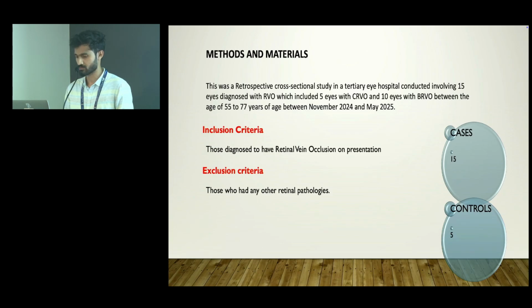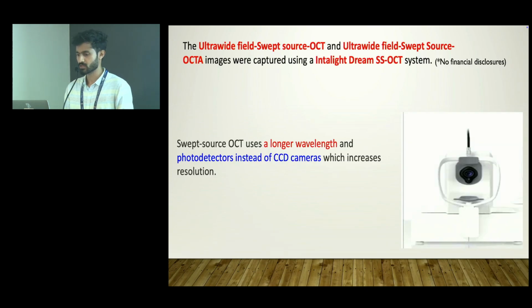and exclusion criteria included those who had any other retinal pathologies. We used the ultra-widefield swept source OCT and ultra-widefield swept source OCTA images, and they were captured using the Intalight DREAM SS-OCT system.